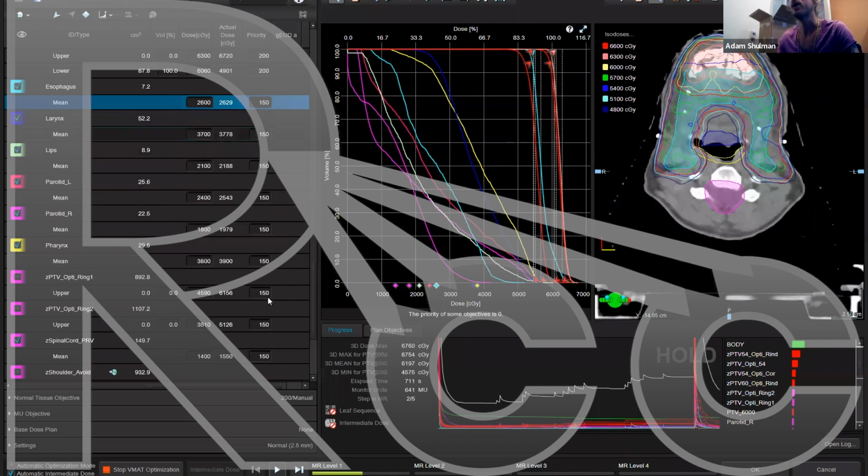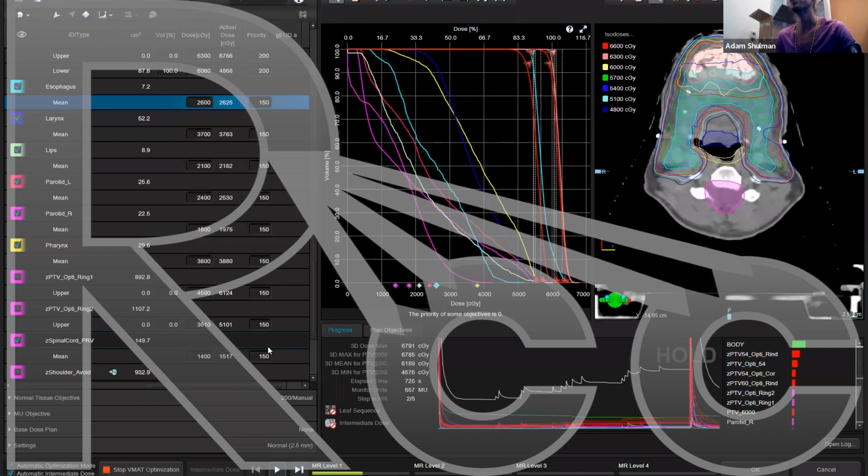And you don't really need to mess with these weightings. I'm probably going to record on my own another tutorial on a large pelvic mass VMAT plan, just to have another one if you all are interested in viewing. And that covers both max doses to small organs at risk, like the spinal cord, and also max doses to large expansive organs at risk to see how those are handled differently. So I'm going to try and record that in the near future as well.